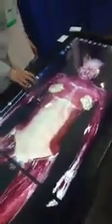Section. So here I can start off with down the middle. And then from here, I can show the anatomy as it was at the time of death. So everything is accurate, there's no rendering done. Since the cadaver was flash frozen, there were scans that were taken of the cadaver itself. And then from there, you can see the anatomy as it was at the time of the death.